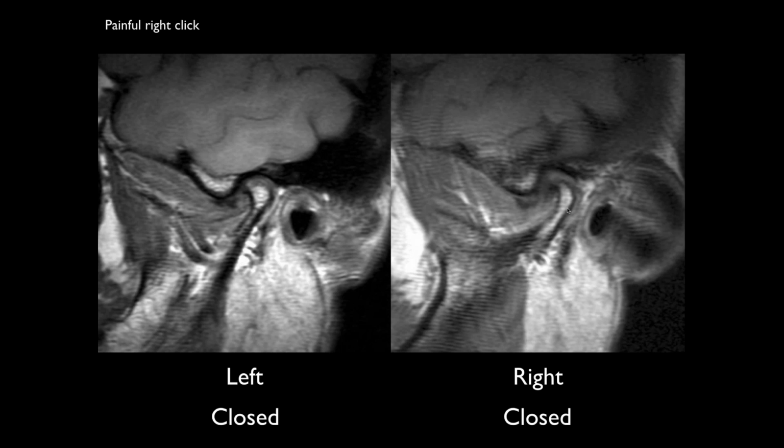What else do you see? Okay, I guess the teeth are clenched here. Is that what this is supposed to imply? No, this isn't. Loss of cartilage? This is just the closed mouth position. What's this?